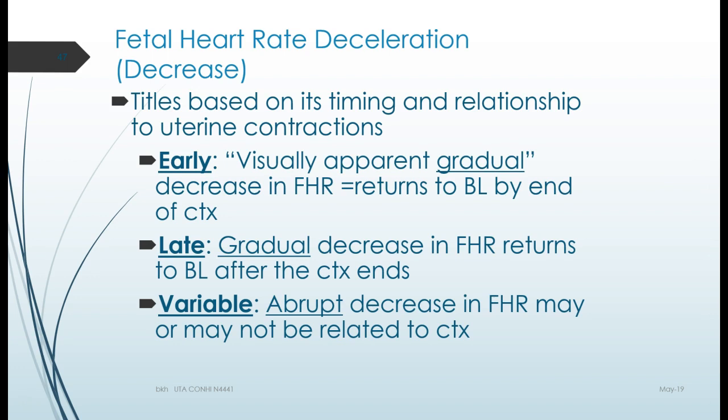The heart rate reaches its lowest point typically at the peak of the contraction. As the contraction eases off, the fetal heart rate goes back up to its baseline, and it is back at baseline by the time the contraction's over. If they mirror each other, that's an early deceleration.